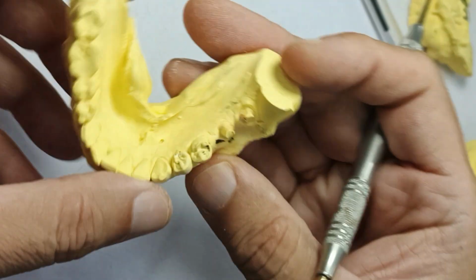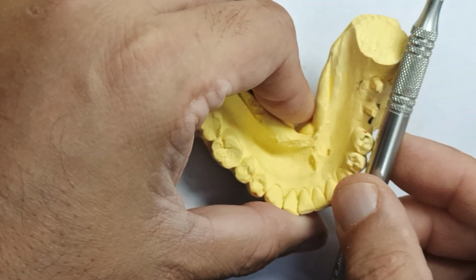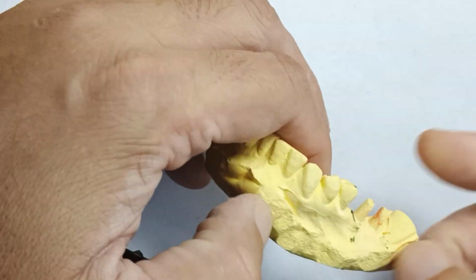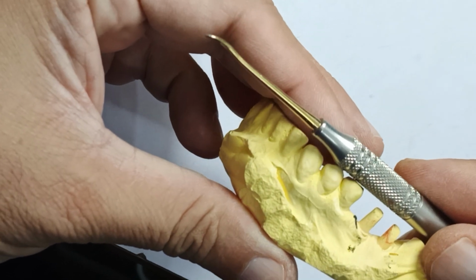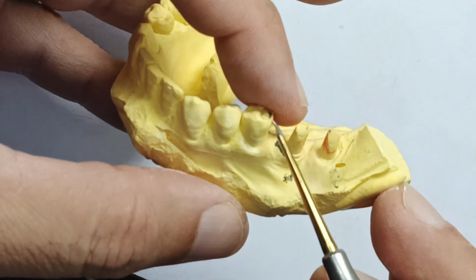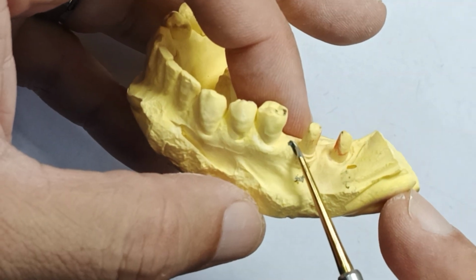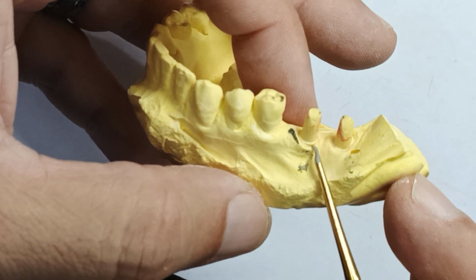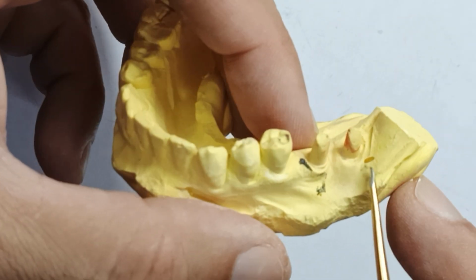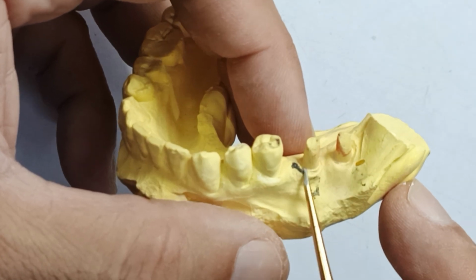Look at this. These are implants. Almost reasonably well, because this is where the midline is. But I do not know if they have enough clearance. Yeah, that looks good. They're almost equidistant, but here the first molar is going to be too wide. So this should have been slightly mesial. And again, I can see little margin right there. On the second one, I see no margin. So this implant crown is going to be open right there and open right here.